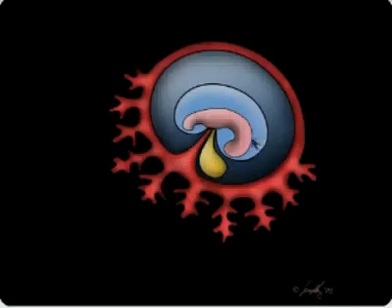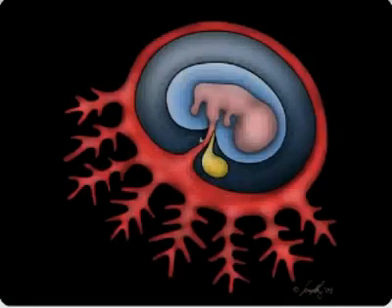The embryo will get a C-shaped contour. All right, notice that the amnion is now getting larger, but we still have a small amniotic cavity, a large chorionic cavity. Also notice that this little guy's starting to jettison his yolk sac here. The yolk sac's really important early on, but once you start getting circulation coming through this little stalk here, they jettison the yolk sac. A little further out, you can see the physiologic gut herniation here. Again, the yolk sac is being jettisoned into the chorionic cavity. The embryo is growing in the amniotic cavity.